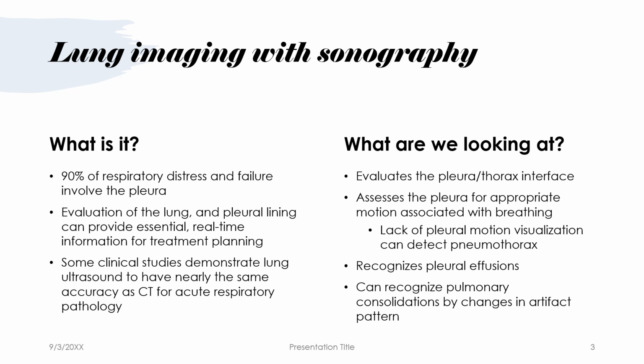If there's consolidation in that lung, it fills up that lung tissue so significantly, displacing that air, that now it acts as a propagation material for the sound, and we actually get an image back. So kind of opposite of what we would generally think in sonography. In lung sonography, in the case of consolidations, the visualization of lung tissue actually means that there is a problem.